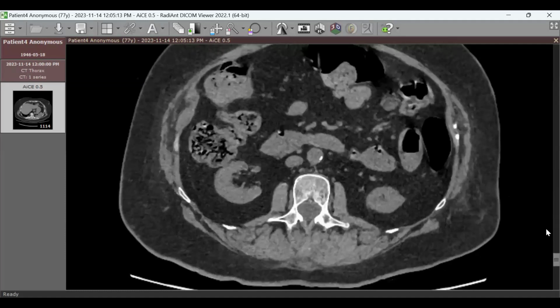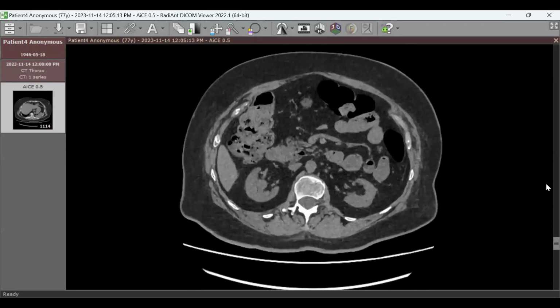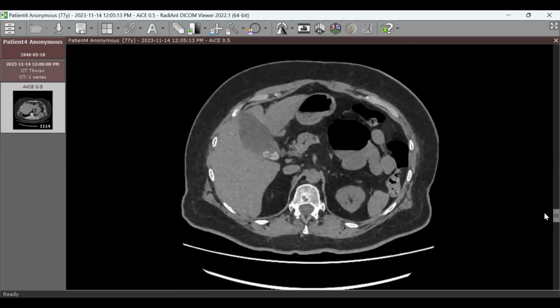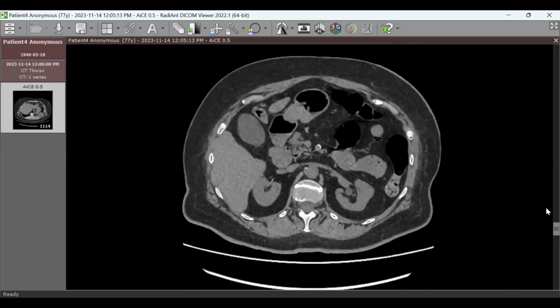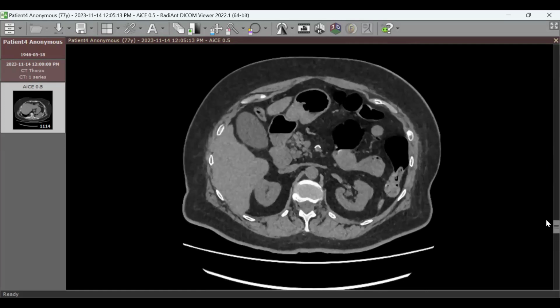Good. Regarding the liver and the spleen, usually in the cases of left-sided rib fracture, we have to check for the spleen if there's any associated splenic injury. Exactly, I agree with you. So the 2 gallstones are an incidental finding. Yes. And when we mention them, we mention that the gallbladder is distended, but of thin wall, with no obvious inflammatory changes. Great, that's the main point.